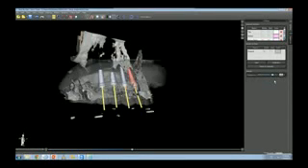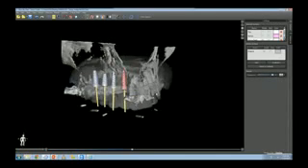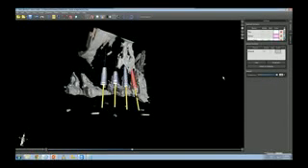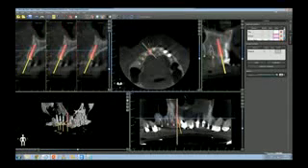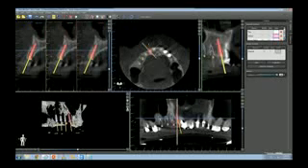And finally, I can superimpose the temporary bridge on top of the patient's bony anatomy, and get a look at the relationship between this implant and the adjacent tooth, and this implant and this adjacent tooth, as final confirmation that these implants are in safe positions. So that's one example of using a large temporary bridge as future tooth position.